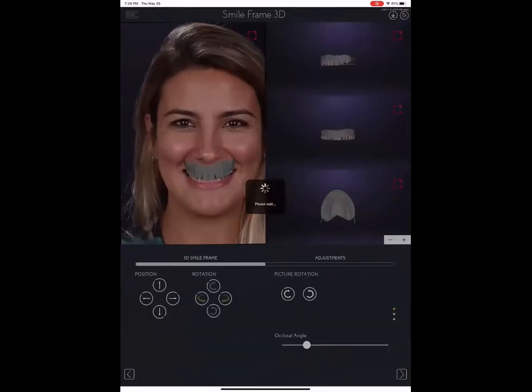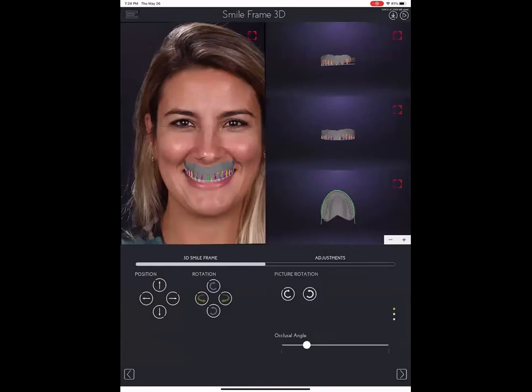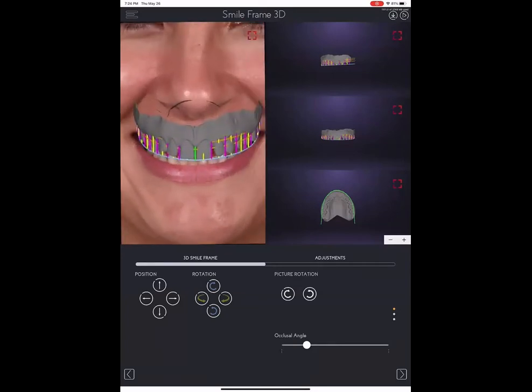It's always going back or moving forward, okay, guys? So here at the bottom of your screen, you will have these two little arrows, which take you back and forth. Here, of course, we're going to be moving forward. Now notice that we already have the patient's face back again.